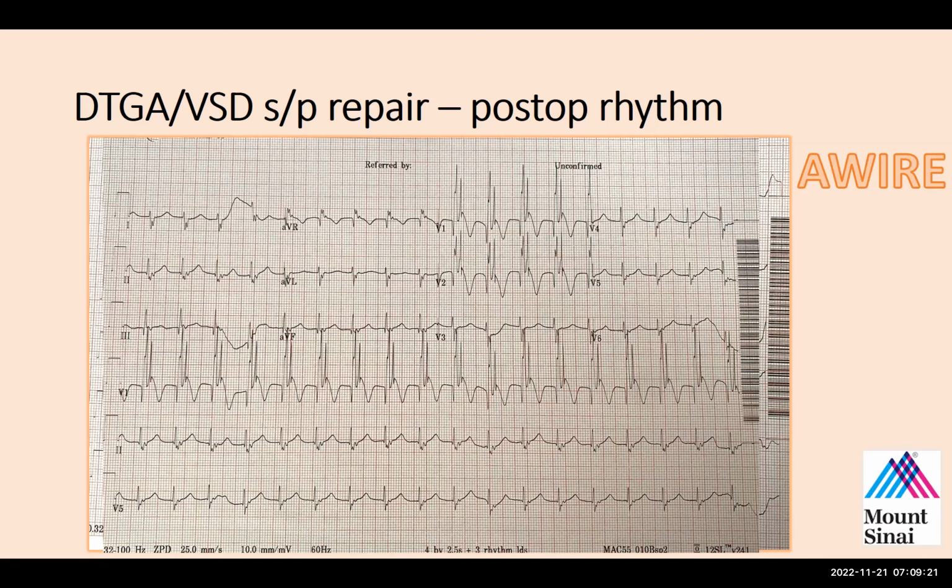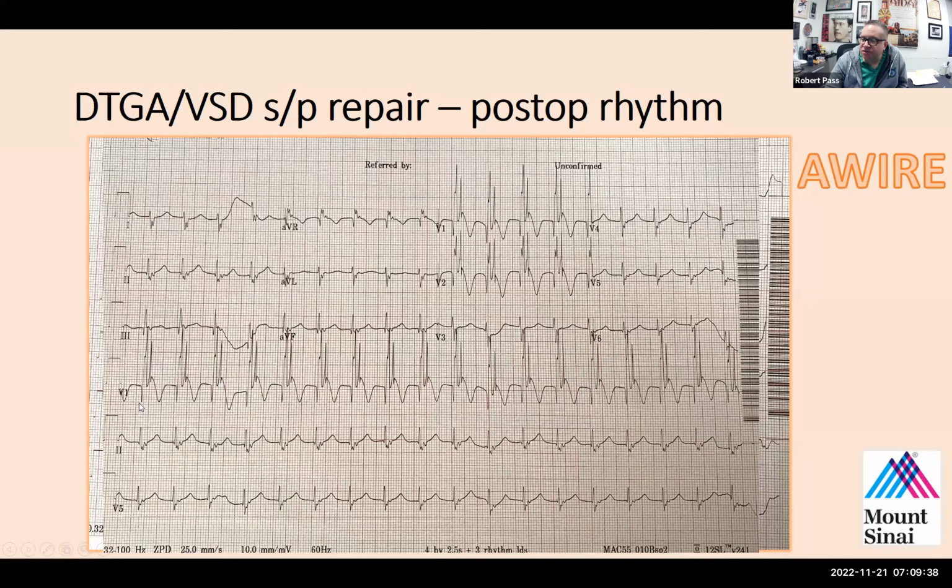Just remember, when you're looking at atrial electrograms, you know where the QRSs are. So V1 is a nice atrial electrogram. The QRS is here, so anything that follows it is the A wave. Because we're recording directly off the atrium, the atrial electrogram will be very large on the tracing. And so we have a V followed by an A in every case. Now, I would argue you don't really need this electrogram, because I do think that this tracing is extremely clear, but certainly may as well take advantage of all the little tools that we have at our disposal at the bedside.